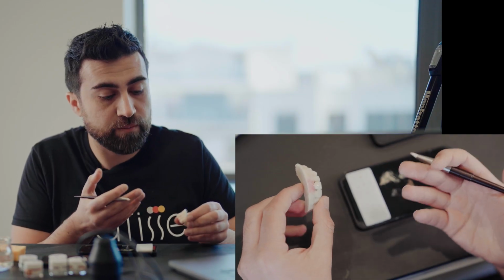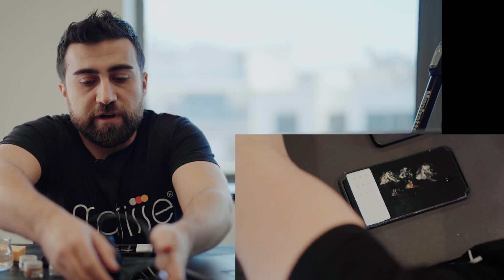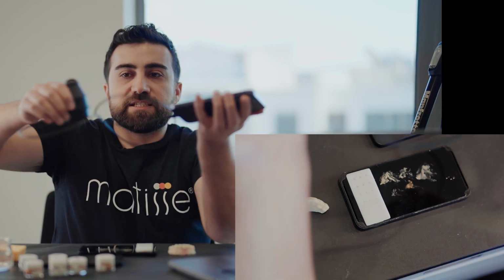But the question is, I painted it now, but how precise is the color now, right? So we'll use Optishade to see how the color is of our staining. So we'll verify the step with Optishade.